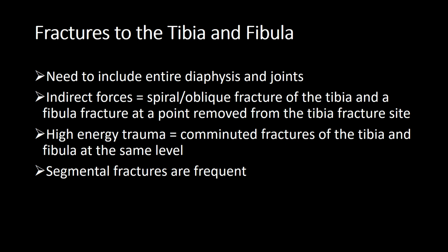The biggest problem is that you get segmental fractures, and they're very frequent. And it's important to comment on whether there is a segmental fracture because, as I think I've discussed before, if a surgeon's going to put down an intramedullary nail, they need to know about that because they will need to make sure that their nail goes through the proximal portion, through the segmental fracture or the butterfly fracture, and then out through the distal portion. So it's quite a tricky piece of orthopaedic fixation there.